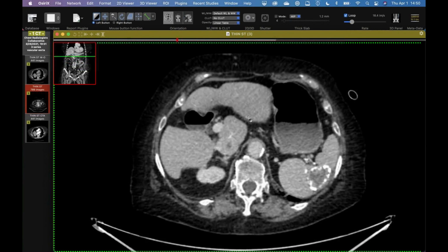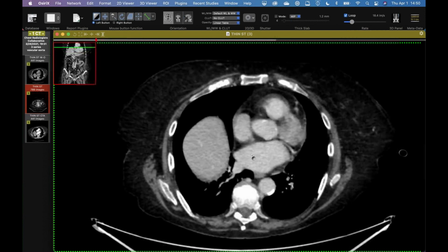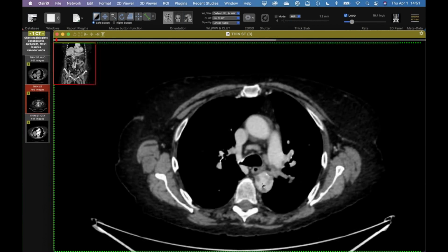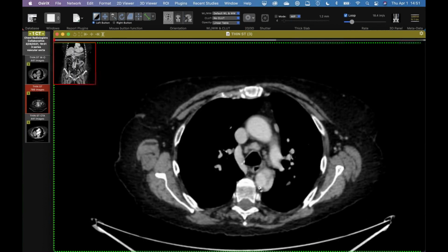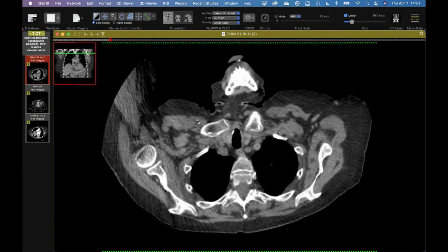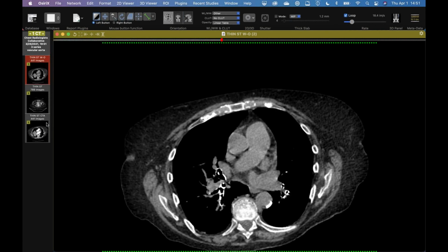And then I don't know if that's an old infarct or something in the spleen, but if we come up to the top of this study, we start picking up some funny looking stuff in the aorta as well. Sort of at the very end, you see there's PE, which was recognized as well, but this sort of eccentric clot, and then this weird looking stuff. There's a plaque here, but this, to me, clearly looks like some thrombus, but the question was, was there an acute aortic process leading to some of this? You see there's a big clot here in the left pulmonary artery. So we did a chest CT, and this is the non-con. It's kind of cool. You can see there's that clot on the non-con there, but no intramural hematoma.